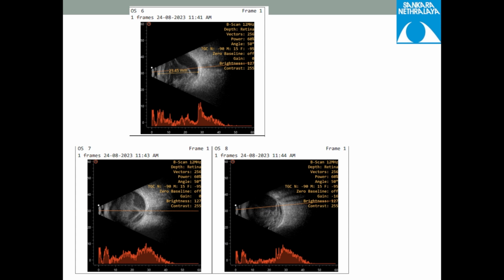So what you should look at is how the A scan reflectivity is within that tissue. The line should pass through the tissue to tell you what the surface reflectivity is, what the internal reflectivity is, and whether the internal reflectivity is homogeneous or heterogeneous, which can tell you whether it's a very compact tissue or a tissue filled with different components. So different reflectivities, different absorption qualities.